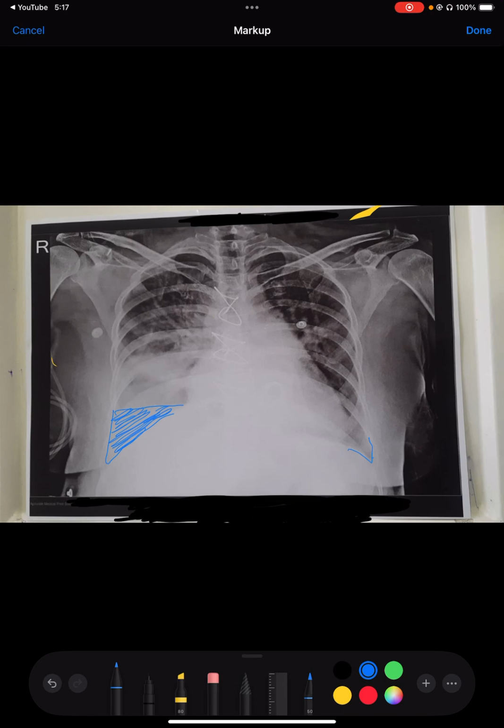But if you have to say a moderate pleural effusion, we can see there is a radiopaque patch here also. If this is only effusion, it should show a meniscus sign. As we know, the pleura are present here, the pleural cavity is here, and the lungs are here. So in between we have a pleural cavity. If the effusion is there, it should climb along this line, so we should get a very nice pleural meniscus. So the pleural effusion should present like this.